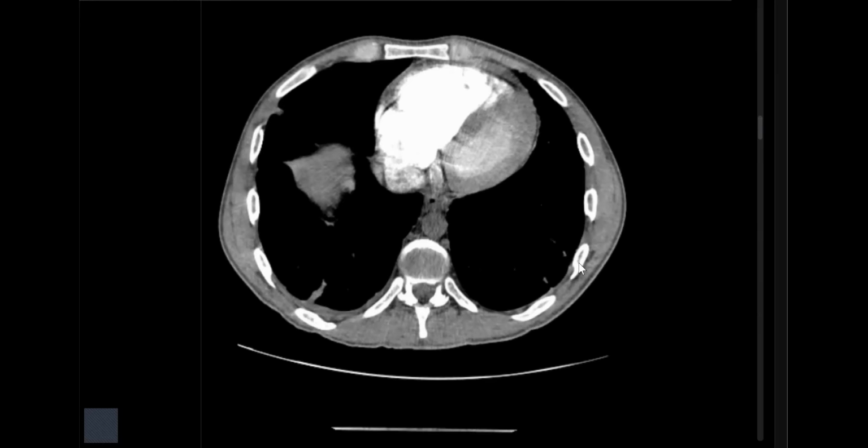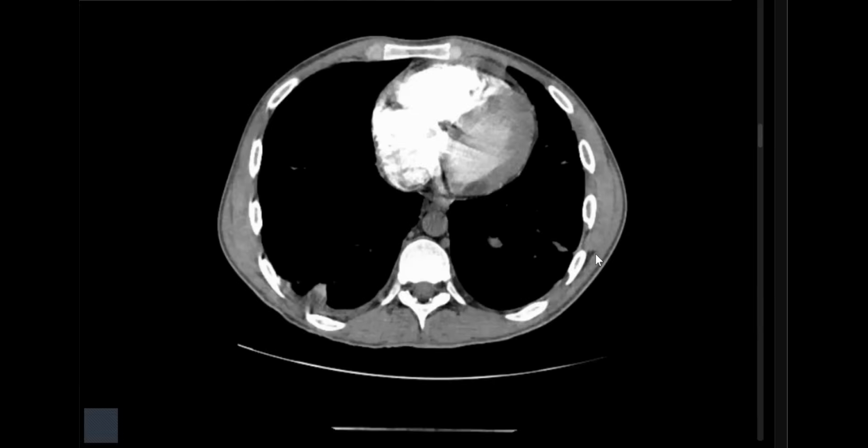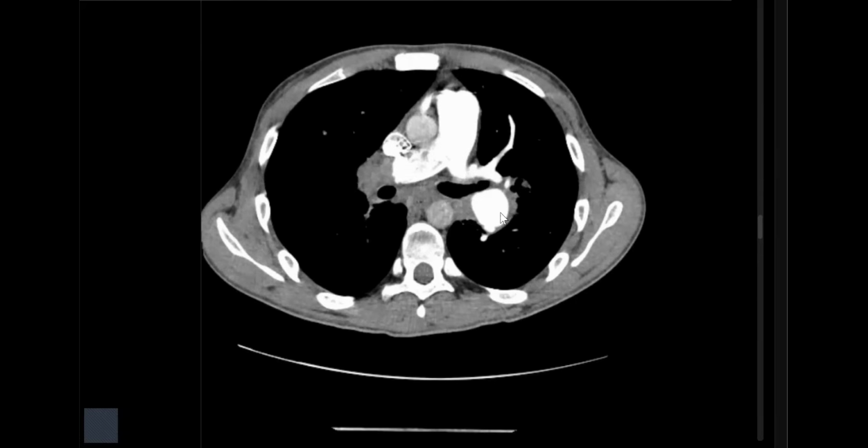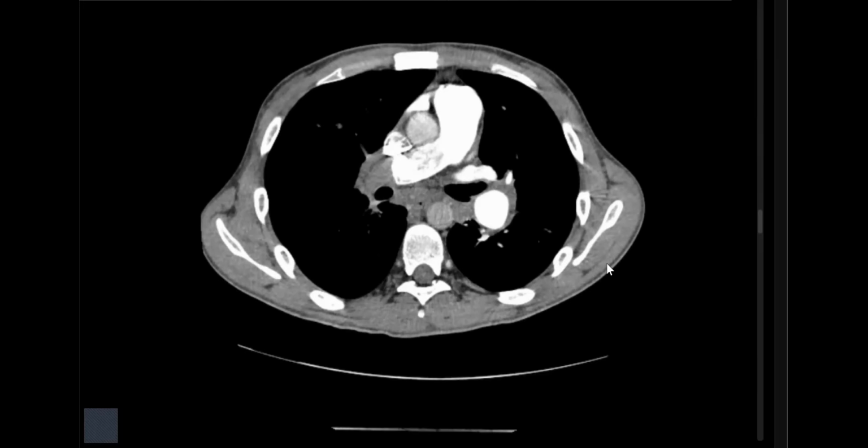What is the explanation of the aneurysmal dilatation you mentioned at the left pulmonary artery? It has two theories. It could be due to an underlying etiology that caused a secondary pulmonary artery aneurysm, or it could be due to proximal dilatation before the occlusion. In case of tuberculosis, I am thinking about a pulmonary artery aneurysm caused by the tuberculosis.